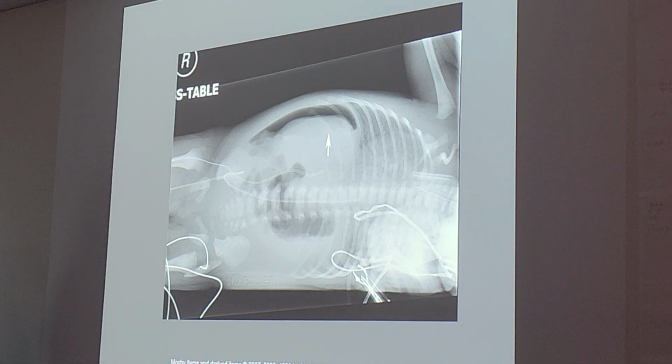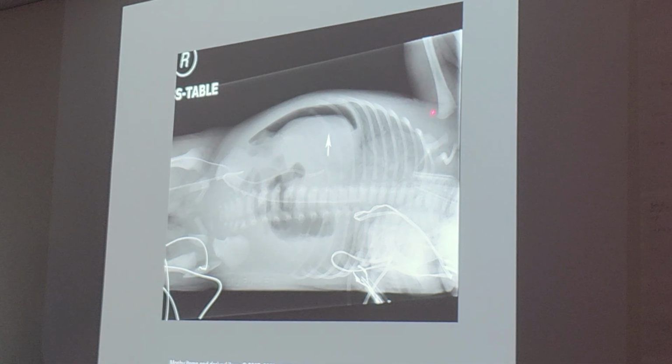Ma'am, I have a question. The space above the leg of the baby, on the right. That's the arm. Oh, I see. The space above the arm of the baby and the space below is equal, ma'am. So I don't know why you said collimation is not correct. It's not equal. If you look from the arm, it's a lot more here than compared to here. I see. So it has to be in the center also, the vertebral column. Yes.